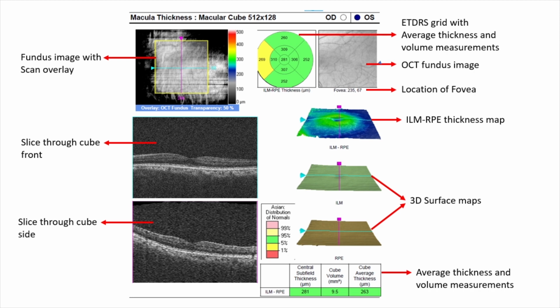So 267, which is the 267th or whatever it was. Scan number 235 intersects scan number 67 at the fovea, or whatever point it is you're studying. In this case, it is the fovea. That's why it's written fovea. You can do it at any point of interest. And it's important because, as she will show you, the next time you do it, if you don't have eye tracking software, you ensure that that is the same point.